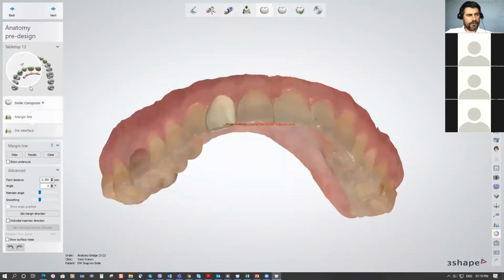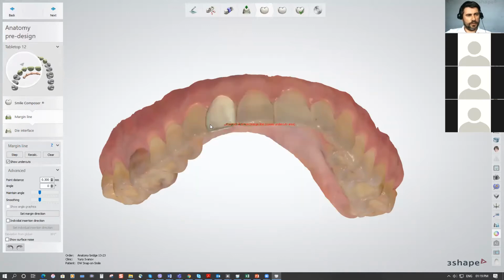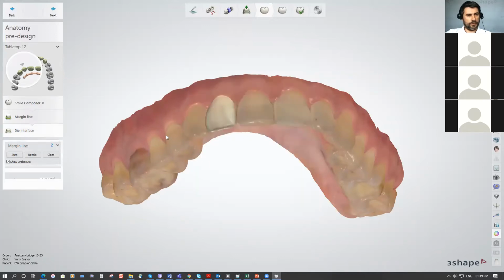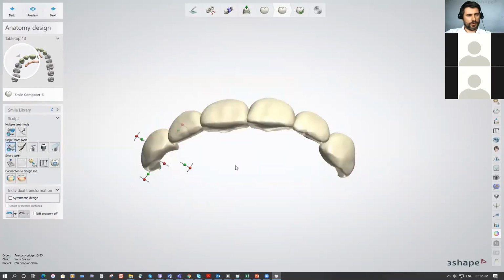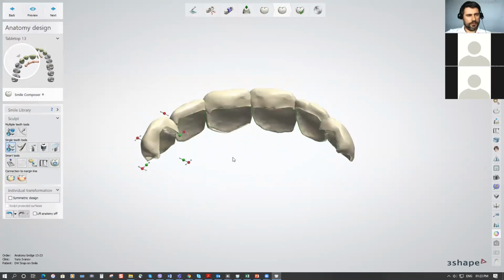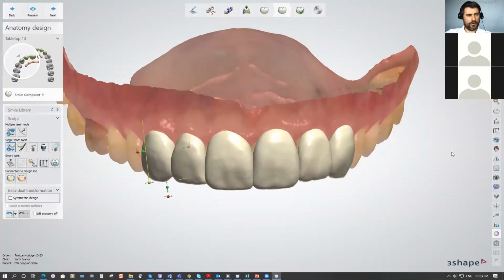Okay, and I wanna just click next, next, next for the rest of my anteriors. The line looks like this without the scan. And what I wanted to show you is this real view engine tool.